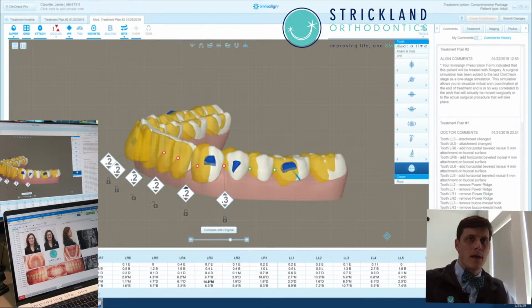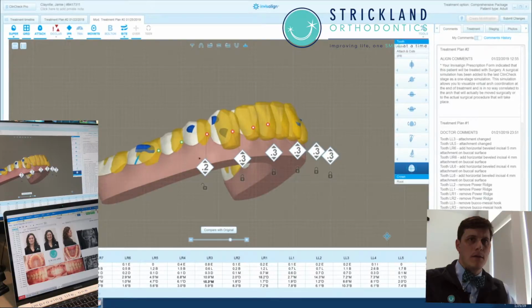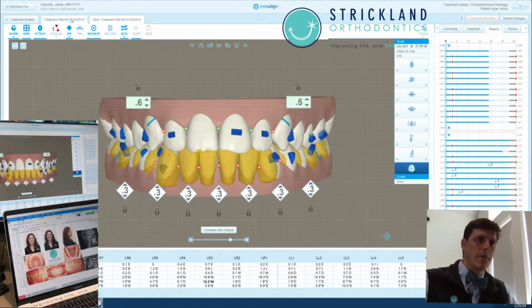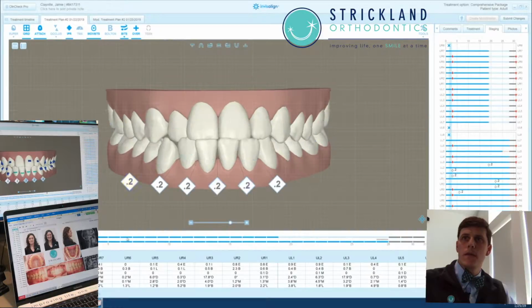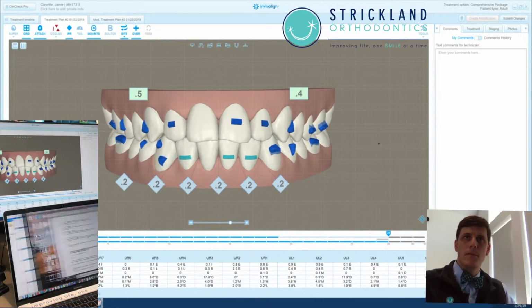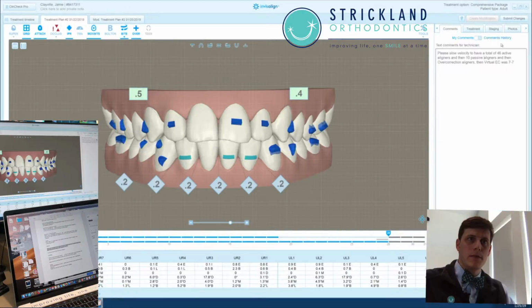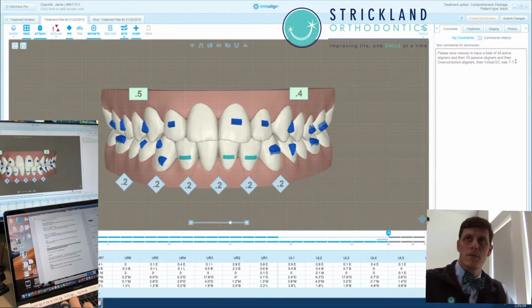There's also a size discrepancy between her upper front teeth and her lower arch. We can then accordingly adjust the size and anatomy of the teeth to make sure that everything fits together just perfect afterwards. And so then our last step is for us to look at actually how the teeth move in concert with all the other teeth. And this is where the technician with this plan has made a couple of errors.